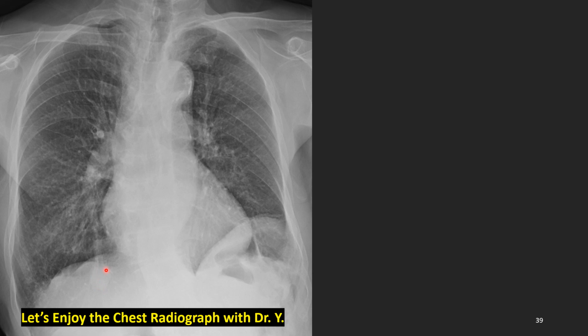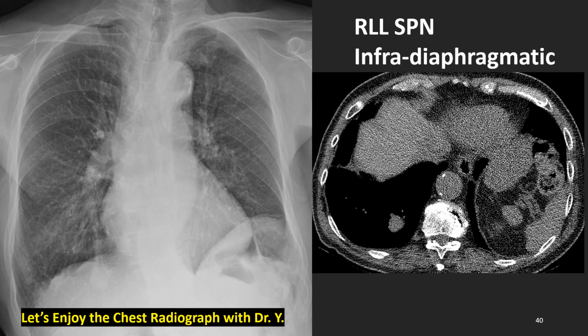Yes. We are trained now. We are experienced now. Most important factor of missed lung cancer is observers. Depends on the observer. Depends on the observer's experience. Yes, we got him. You see the nodule here, right lower lobe. Not in the liver, yes.